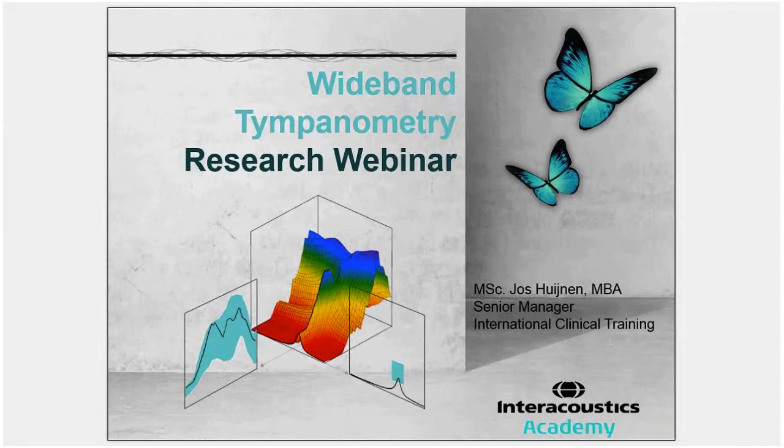We're going to start with the Wideband Tympanometry webinar about how to use the Titan for research purposes and how to use Excel in combination with that.